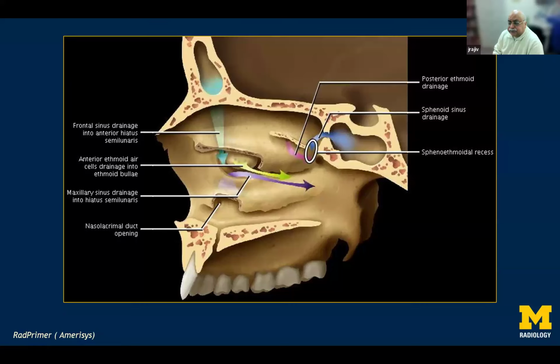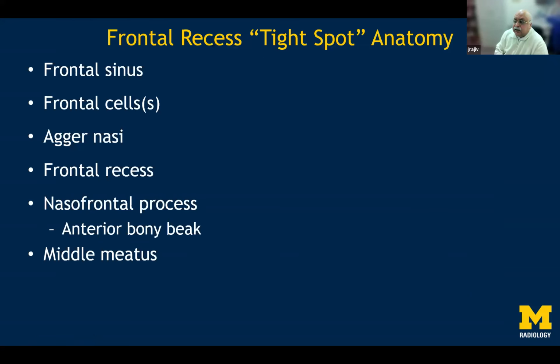So we will look at the drainage pathways individually in three different sets of slides for each of these narrow segments of the paranasal sinuses.